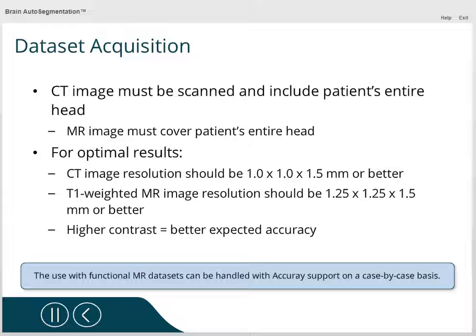The primary reason why rigid registration is preferred is the fact that the CT scan has limited intracranial contrast, that is, it is difficult to see brain structure in CT, which could lead to introducing undesirable deformation to the MR dataset.